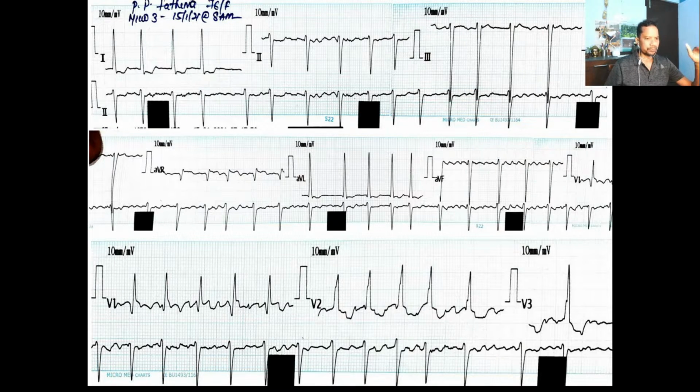Okay, so now we have come to the atrium, and you can take your time. There is no need to be in a hurry. Like right now I'm making the video and I'm just looking at the ECG. I should not be in a hurry. So I have to set an example.